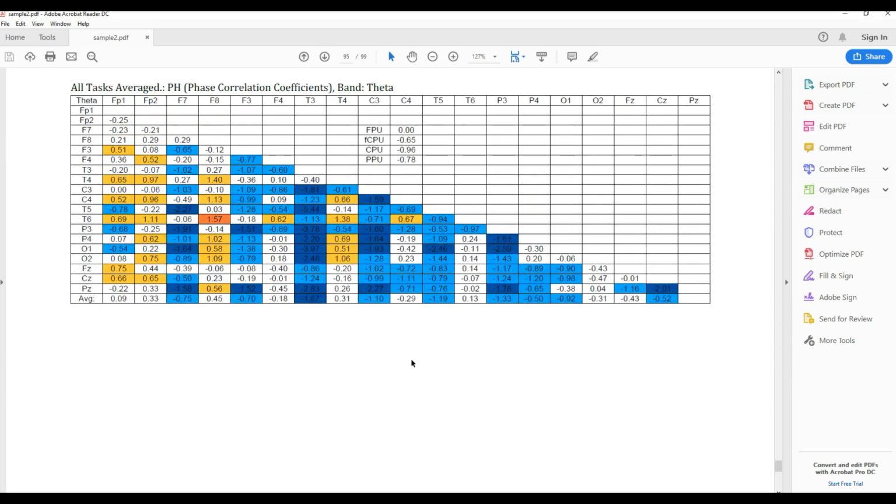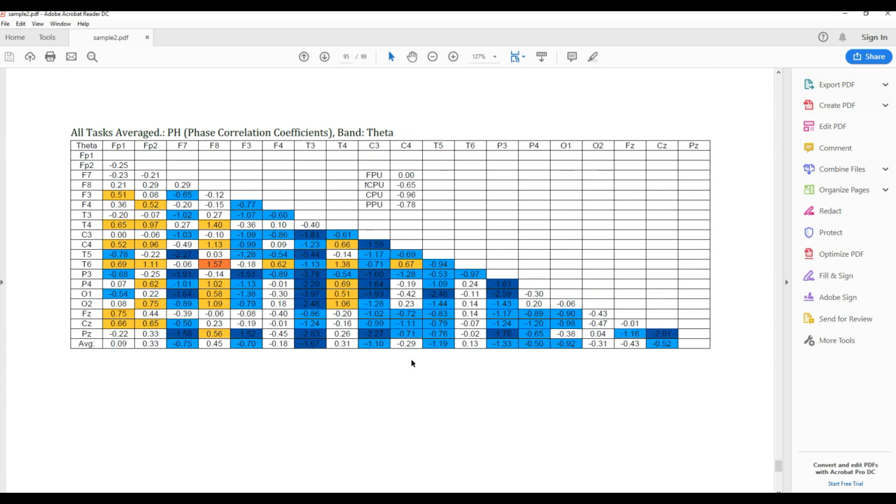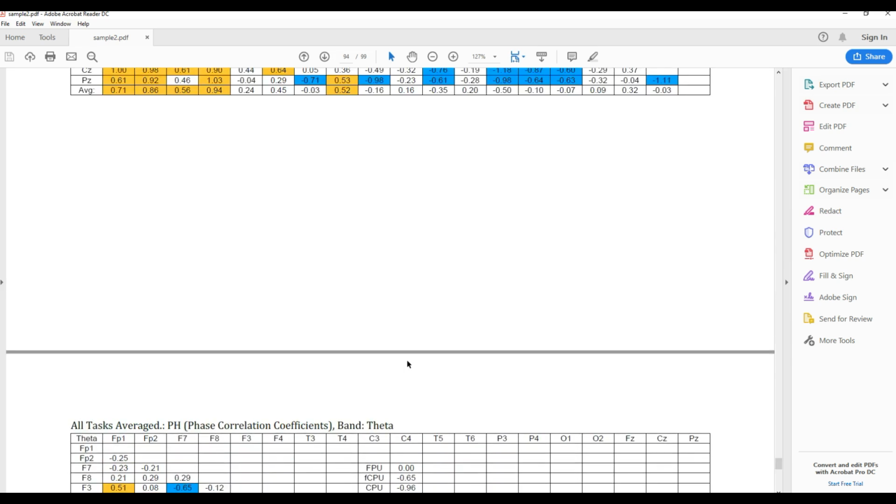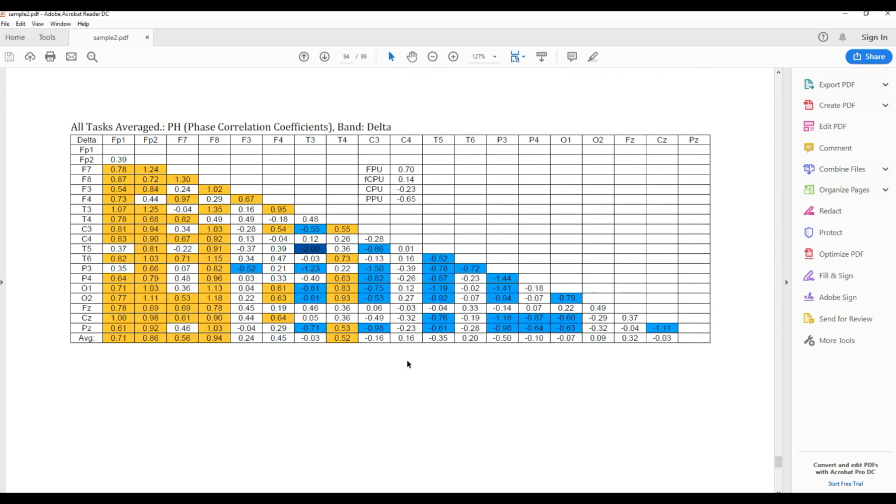As we move up into the theta frequency, we continue to have some problems here. Theta is less desirable as an intervention focus because sometimes it's negative and sometimes it's positive. So generally working with the alpha to beta 2 frequencies is preferred in terms of the efficiency of the sessions, because you don't have an unlimited number of sessions. As you can see, delta continues to show the problem at T3.